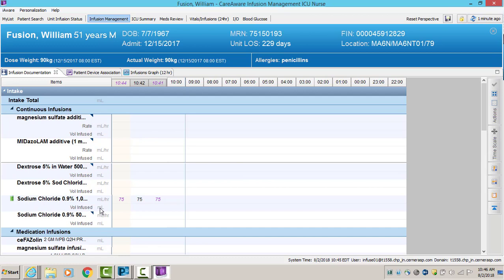Verify the correct data displayed for the rate of the continuous infusion. If we were to hang a subsequent bag, we would see the rate in gray, and it would not require signature. Purple font signifies unvalidated data that needs signed if we want it to flow to the patient's permanent medical record. For instance, for rate changes, hourly volumes infused that display in our hourly columns, and any changes we make on the pump, such as bolusing from existing infusions.